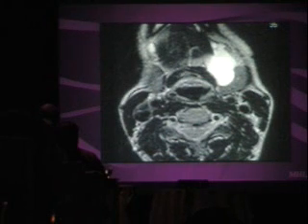Let me just make one point when you're distinguishing. This was actually a cystic hygroma, not a ranula as well. You have to certainly window correctly, look for those septations. Cystic hygromas are developmental malformations. Again, lymphovenous malformations. They will not spontaneously regress. They are hard to treat.